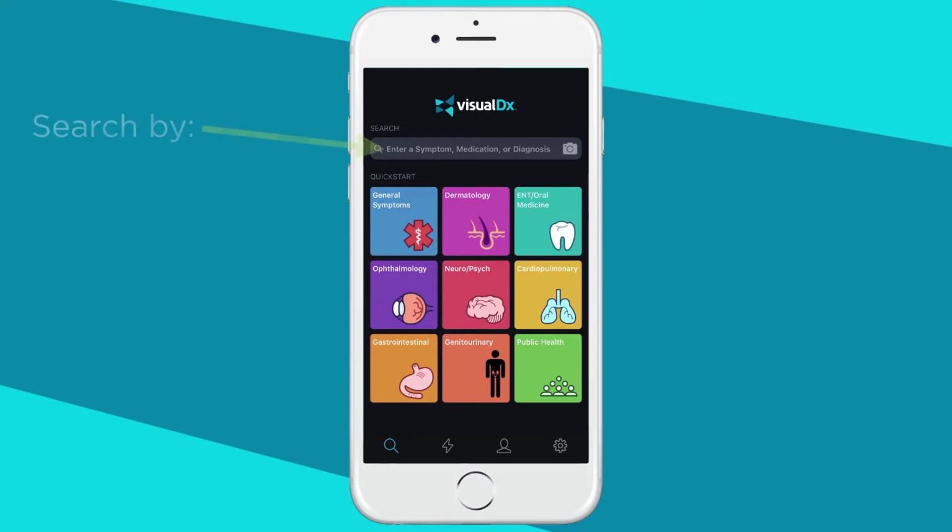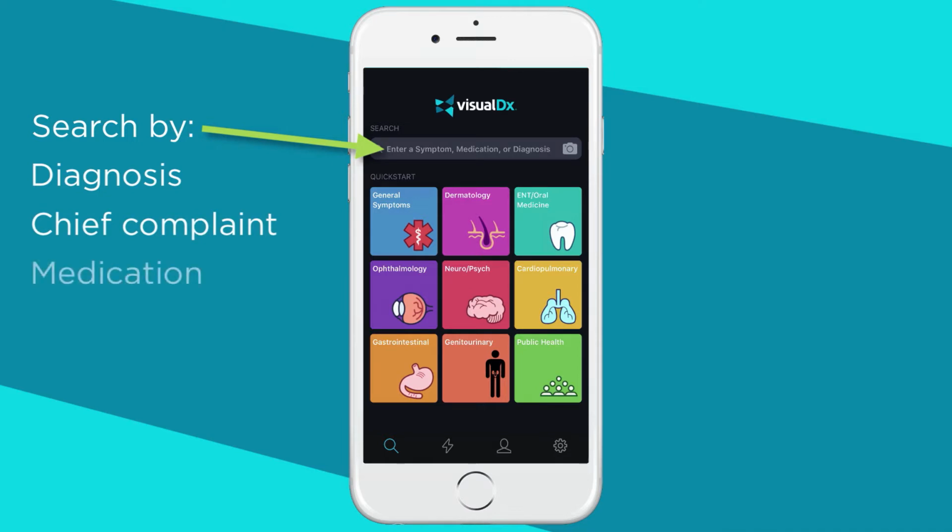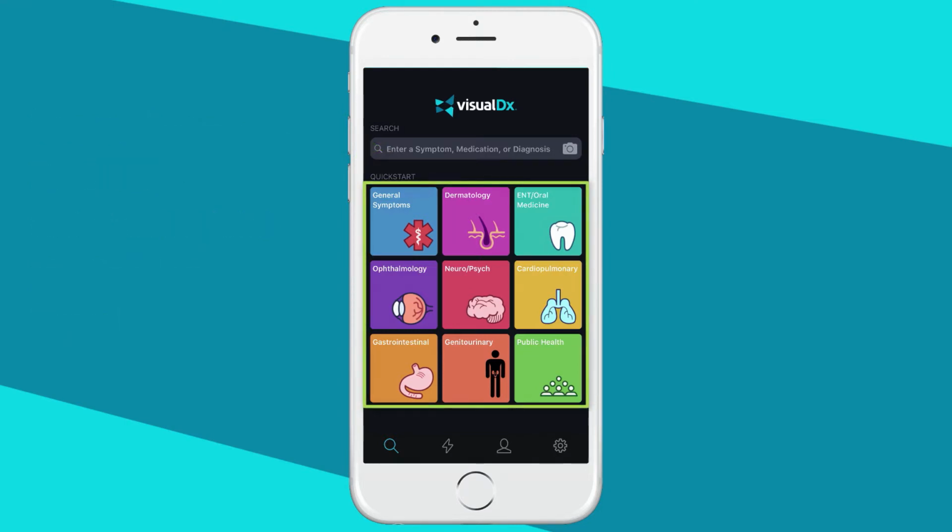From the homepage, you can search for a disease or build a differential in seconds based on a chief complaint, medication, or travel finding. Or click any of the 9 specialty tiles to start a guided workup in that specialty. If you have the Derm Expert add-on feature, you'll see a camera icon in the search bar, which you can then tap to take a picture of your patient's skin. Watch our Derm Expert walkthrough to learn more.